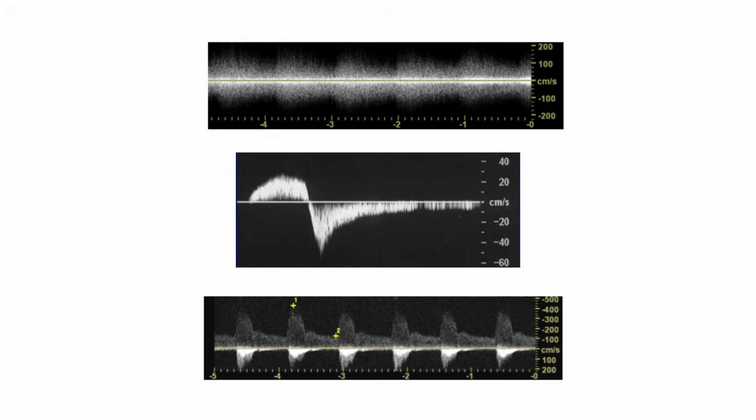All right, here we have some spectral Doppler waveforms. So let's figure out how to do this. Instead of finding where a probe is, or using the color of the vessel and matching it up to the color bar, we're going to use the spectral waveform and match it up to the positive or negative velocities. This might sound confusing, but don't let it be. Just flow with me here, okay?